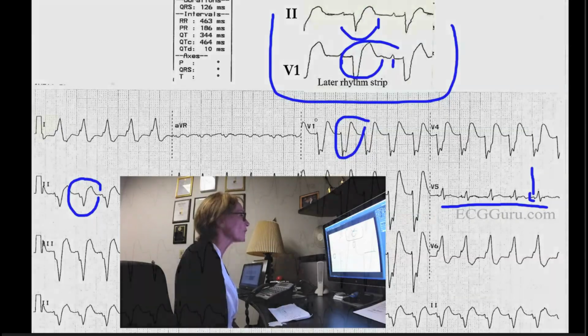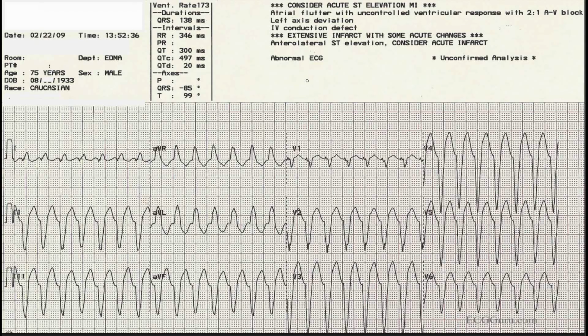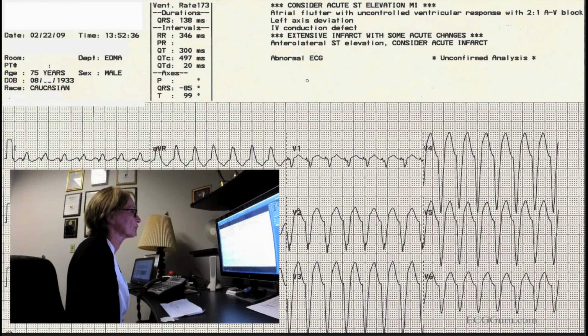So I'm going to show you another strip. Now this ECG is interesting because I left the interpretation at the top because it's all wrong. Everything's wrong about it. And I just want to remind you that the interpretation isn't always right, and you should always look at the ECG yourself.